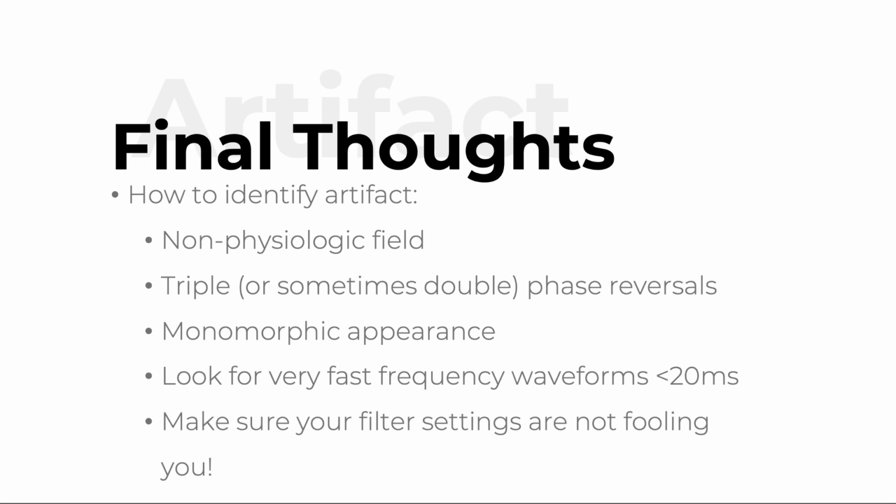Be very careful with your filter settings. Make sure your filter is not fooling you. And also make sure that you are not missing time-locked waveforms with the ECG, and waveforms that are very clock-like, that are completely rhythmic. You really need to consider artifacts. So those are a few bonus points to throw in there.